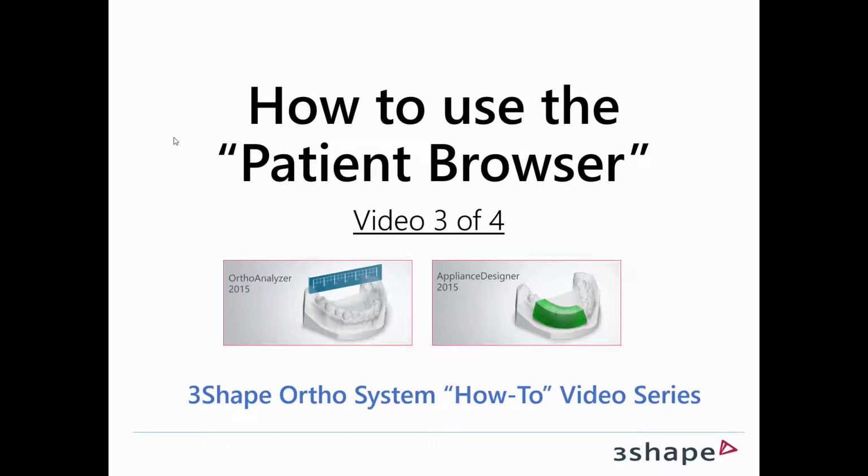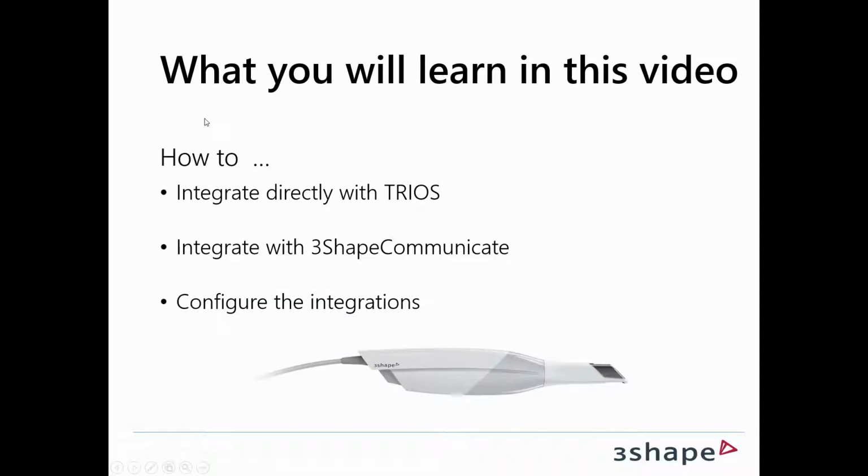Welcome to the third video of 4 teaching you how to use the patient browser in the 3Shape ortho system. In this video you'll learn how to integrate directly with the TRIOS intraoral scanner, how you can integrate with 3Shape Communicate, and how you configure those integrations.